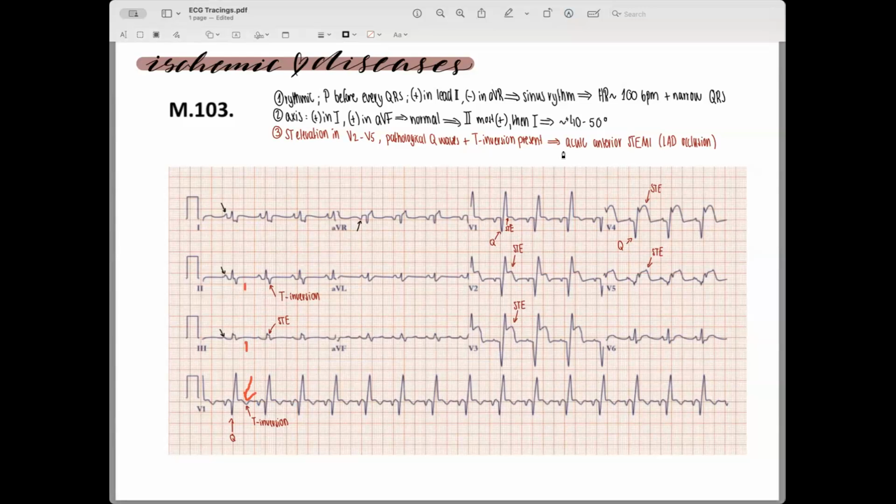So this is not a T wave. That's a QRS complex. The ST widening a little bit is due to the ST elevation, so the ST elevation that you can see is somehow altered as well. I don't think that is a T inversion, because the T wave should be a little bit further from the QRS complex.